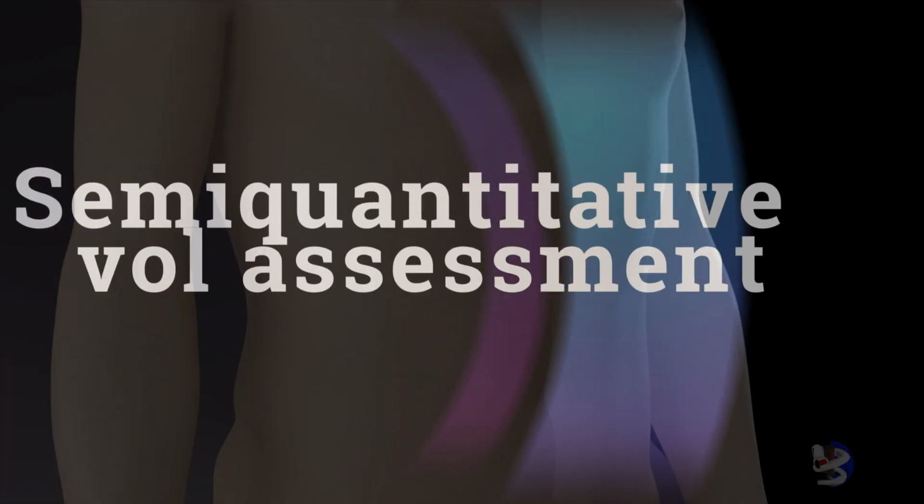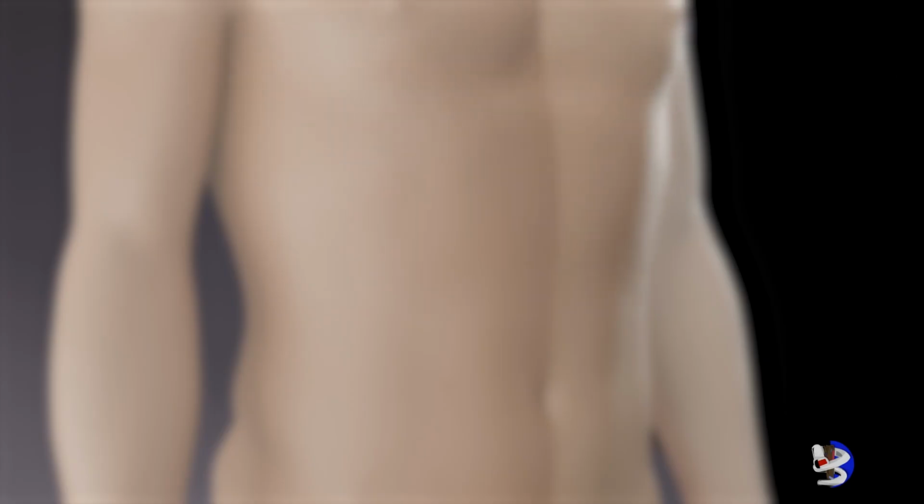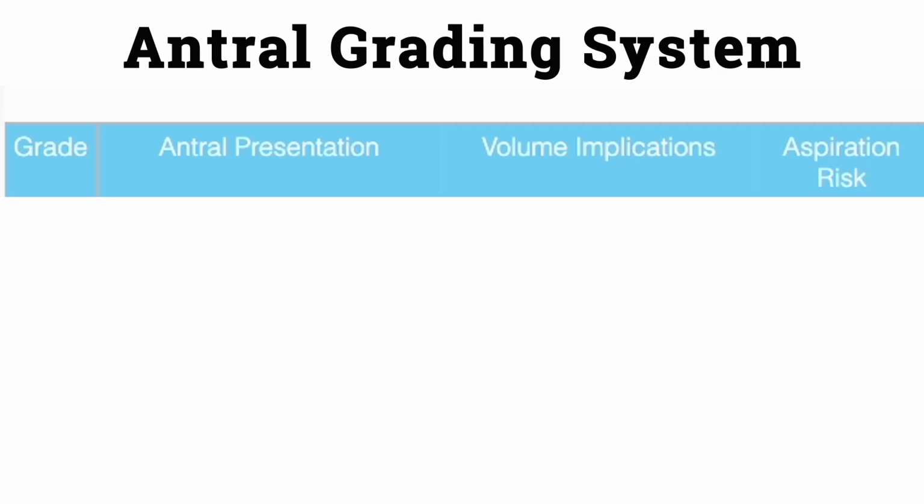Semi-quantitative volume assessments. There is a myriad of clinical scenarios where making measurements and deriving a volume is simply not possible. In fact, like I mentioned earlier, the POCUS exam should focus on qualitative or semi-quantitative assessments. As it turns out, there is a semi-quantitative grading system to differentiate clear, low from high volume states by comparing gastric ultrasound findings in the supine and then performing the scan in the RLD position.